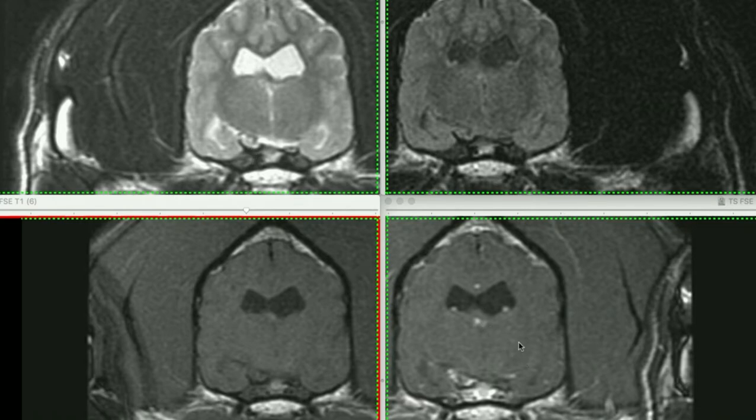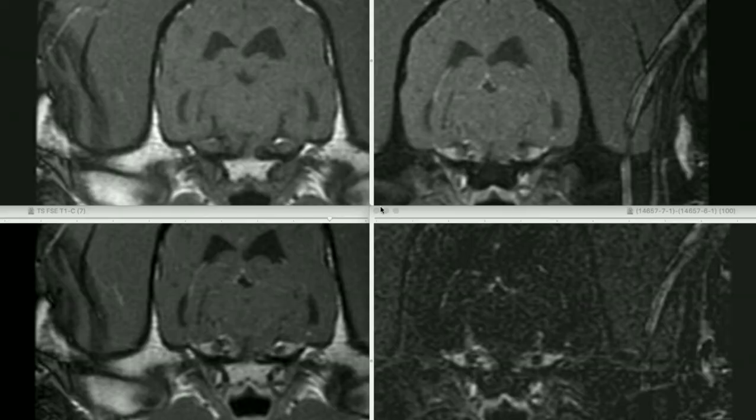In this particular case, we have a fat suppressed sequence, and that's very helpful. Here we have the T1 pre-contrast, the normal T1 post-contrast, and additionally a T1 post-contrast with fat suppression. If we look at the bones of the calvarium, we can see the suppression of fat in the normal cancellous bone, and that's very helpful, particularly when we're looking at pathology in the ventral aspect of the brain or cranial nerve disease. We can see it's much easier to evaluate what's going on when we null the signal from the fat.